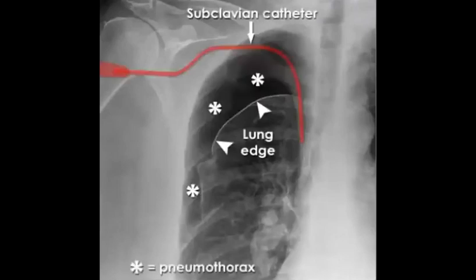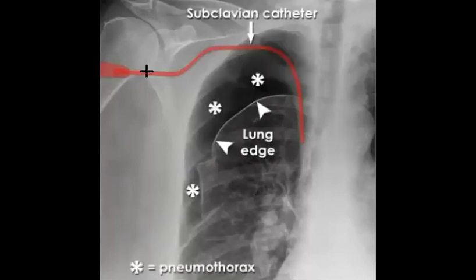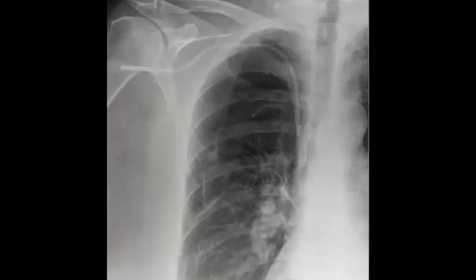So what happened here? This patient, perfect. You can see the catheter is going well, but what happened? The pneumothorax happened here. So it is an adequate position, but there was some complication when he inserted it. They made an injury of the pleura, and this patient developed pneumothorax.